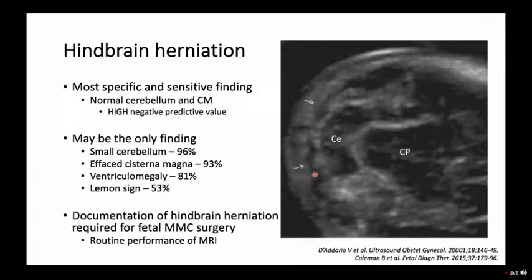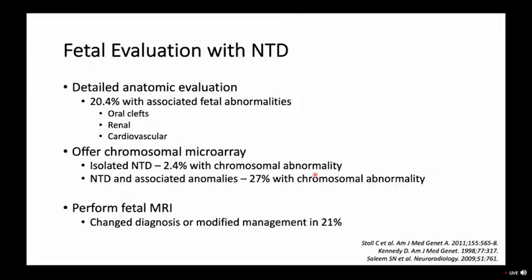It's a requirement, actually, if in utero surgery for spina bifida repair is ever to be considered. I will tell you, though, that if the cerebellum, the vermis, the cisterna magna, the lateral ventricles, that posterior fossa, if it looks normal, everything measures appropriately and it's anatomically normal, it's highly unlikely there's anything else wrong in the brain, and highly unlikely there's spina bifida. Babies with spina bifida, on occasion, 1 in 5 have some other abnormalities. Clefting and cardiovascular abnormalities are common.